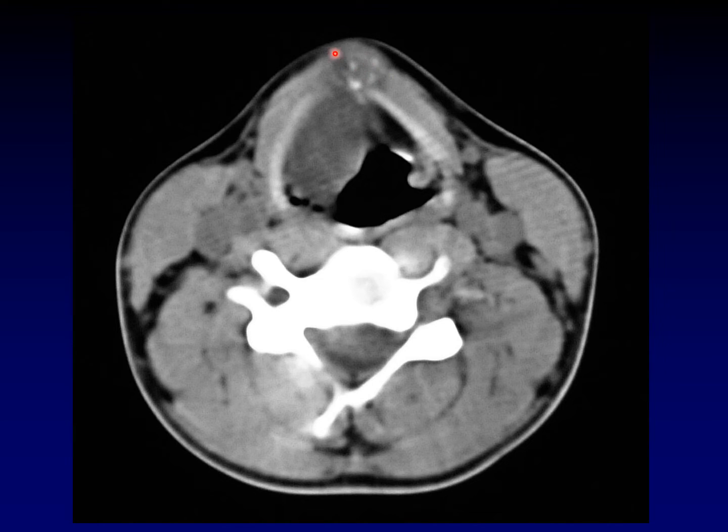This patient has a nodule at the periphery of this thyroglossal duct cyst embedded within the strap muscles. And this nodule has calcifications within it. These are the signs of thyroglossal duct carcinoma. Thyroglossal duct carcinoma doesn't tend to occur in children. It tends to occur with the same demographic characteristics that thyroid cancer has, particularly papillary thyroid carcinoma has in the adult population. So we're looking for teen to young adult, and more commonly in women when we're looking for thyroglossal duct carcinoma.